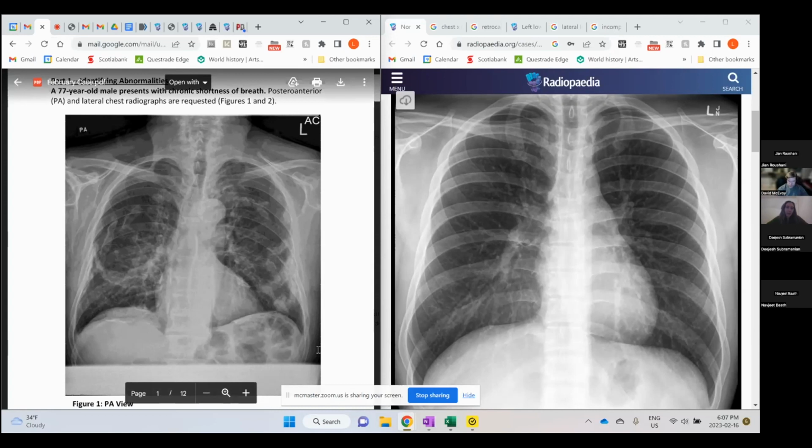And essentially, since we just have black and white, most things that you see, or I guess all of them, are either too white or too black. So too opaque or too lucent. I think it's good style to talk about things on radiographs in terms of opacities and lucencies as opposed to consolidation, because you don't really know if something is a consolidation or not.